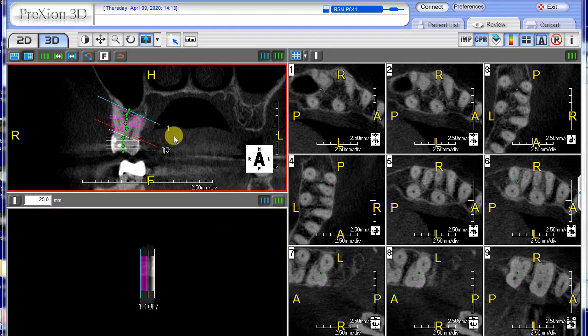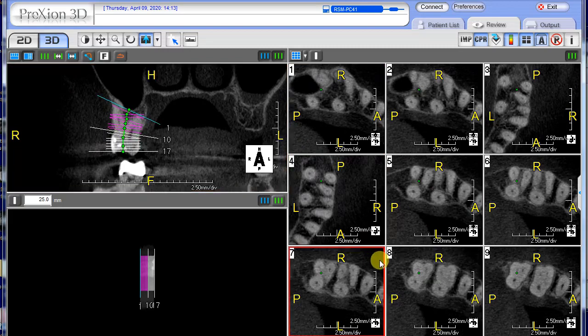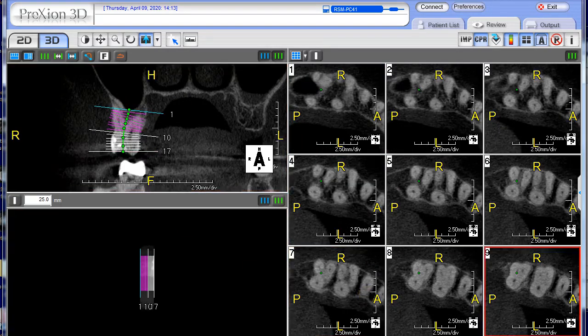When you're done, you can always go back, grab the dot, put the little white hand over it, grab it in the center, and you can check your work off to the side. And then you can correct the dots each in a row as you go. So you get a nice even look here to your matrix on the right panel.